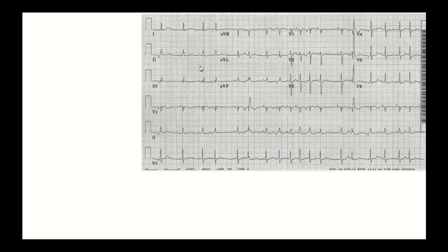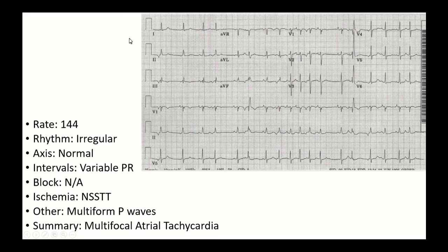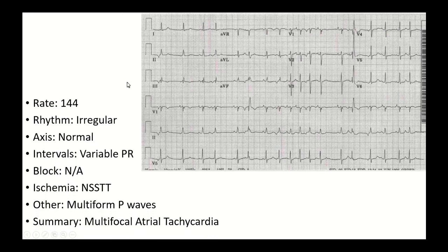Yeah, that's the summary. That's the main things here. So this is an uncommon rhythm, but one that's worth keeping in the back of your mind. Not everything that is chaotic is atrial fibrillation, and so this is an example of multifocal atrial tach with non-specific ST wave abnormalities.